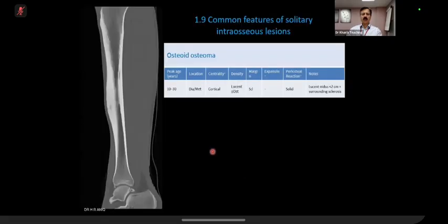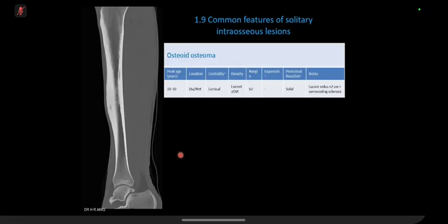And on a CT scan, now I'm showing you this CT, just a single. What is your final conclusion on this CT? Over to candidate one. So the findings on the CT would support a diagnosis of osteoid osteoma, with a solid cortical thickening with a central lucency, keeping with the nidus.